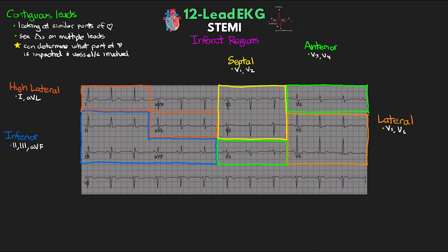Now, there's really not many things that I tell you guys that you really need to memorize on this channel, but this chart and these contiguous leads really is something you should commit to memory. It's really not that difficult once you know the pattern, so I really strongly urge you to do so.